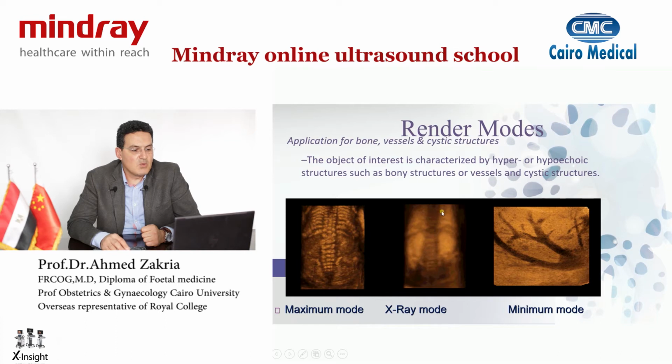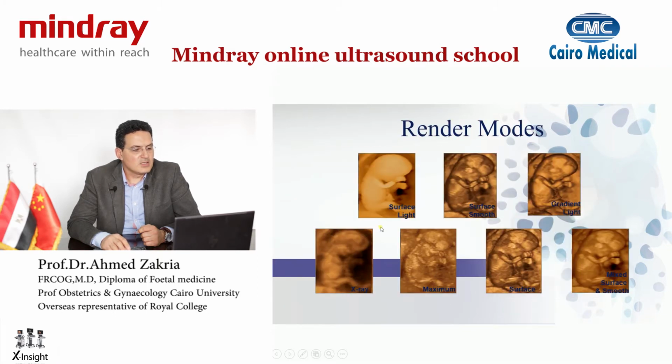Or you can use an X-ray mode where you dampen the hard tissue and you can see all the surface soft tissue structures across it. This is just a model of how we can use it. You can use a surface model where you can see the surface of the baby. If you use a maximum mode, you'll be seeing the bones. If you want to use the X-ray mode, you'll only be seeing all the soft tissue without seeing the bony part of it.